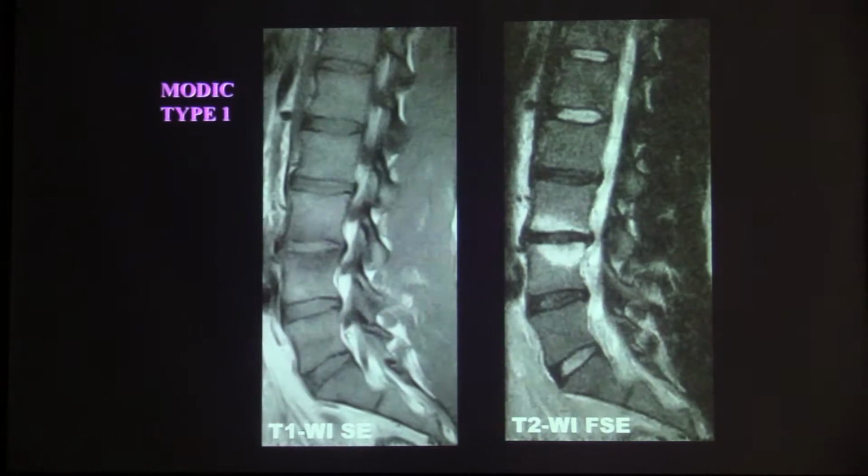So what do these look like on MRI? Here's a classic one. You have low T1, bright T2. We're basically following fluid signal. It's hemispherical, it's abutting the end plate, and the disc is degenerated, meaning the disc signal is dark, although sometimes the disc can be a little bright because of gas in there. But this is our classic degenerative end plate change. You can call them Modic changes, you can call them end plate reactive changes.